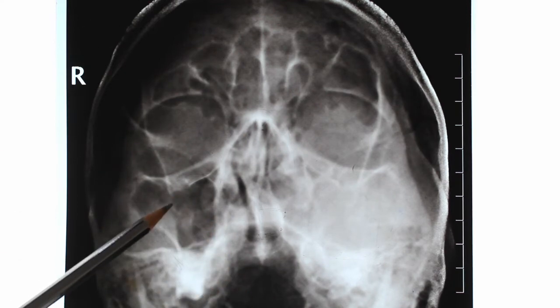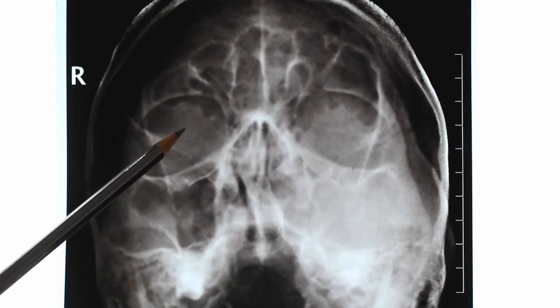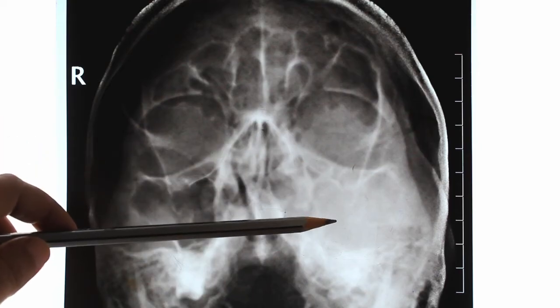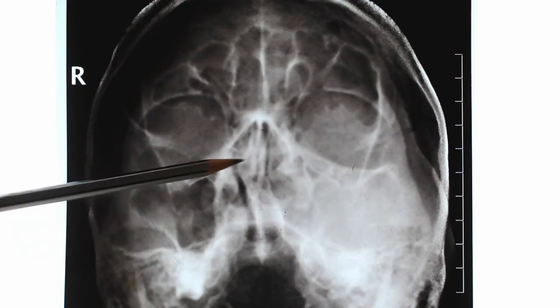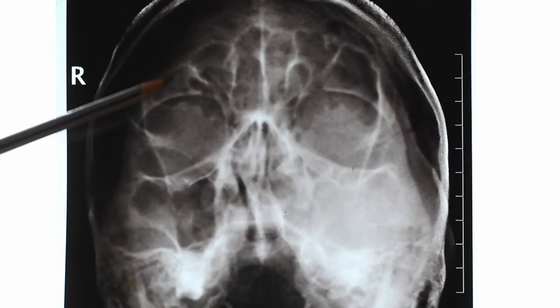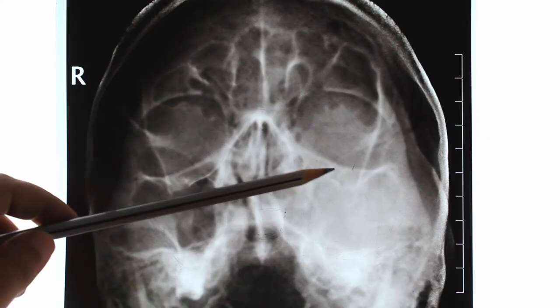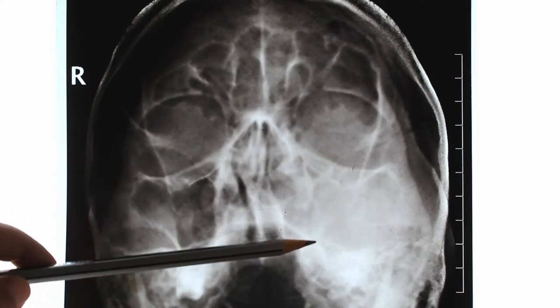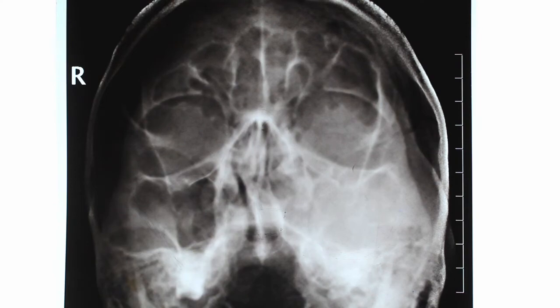The opacity of the maxillary sinus or any sinus is compared with that of the orbit. If it is more opaque than the orbit, it is pathological. So in this case, what is the finding? X-ray paranasal sinus, occipitomental view with open mouth, showing opacity in the left maxillary sinus. The differential diagnosis of opacity of the maxillary sinus you have to study.